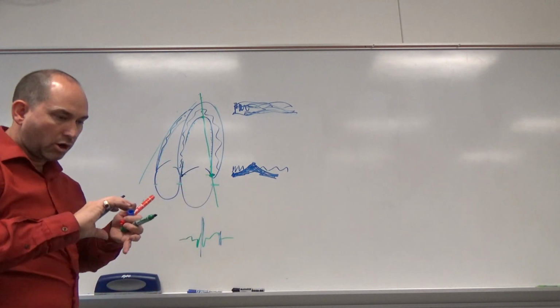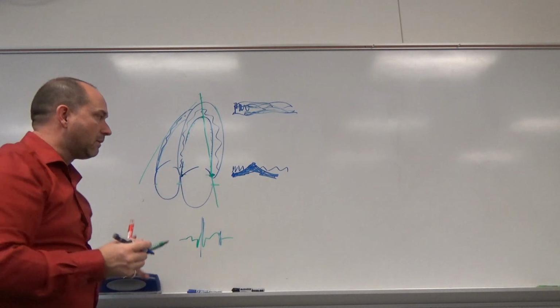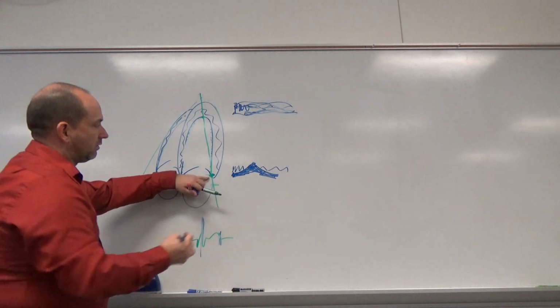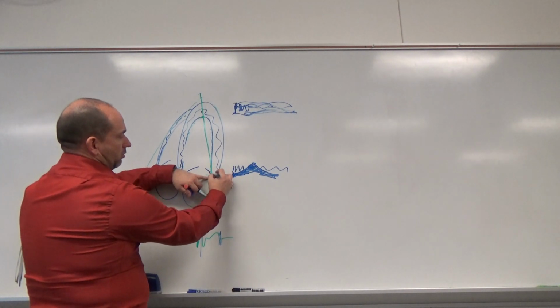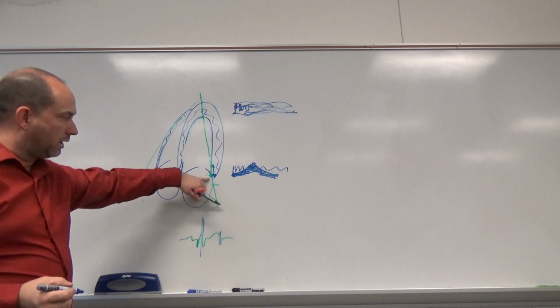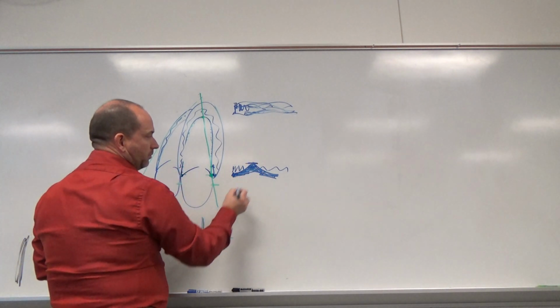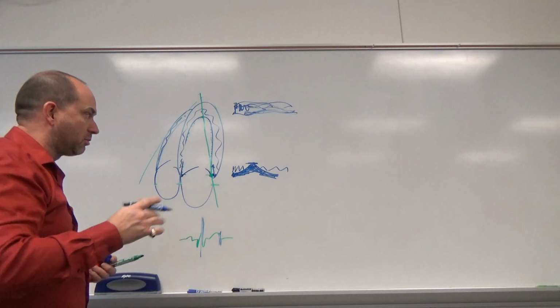So basically when the heart squeezes, it twists, it squeezes this way, and it thickens. What we're looking at on this, being M mode, is that this segment of the wall, that annulus, is moving away and towards and away the apex. And the more this rises, the better the systolic function. We'll talk about this more later.